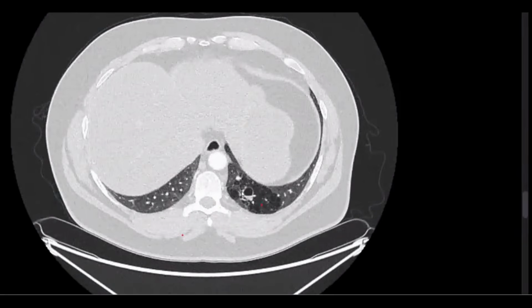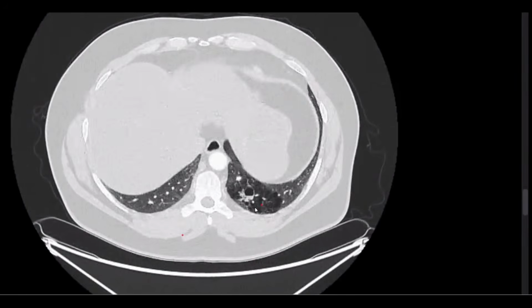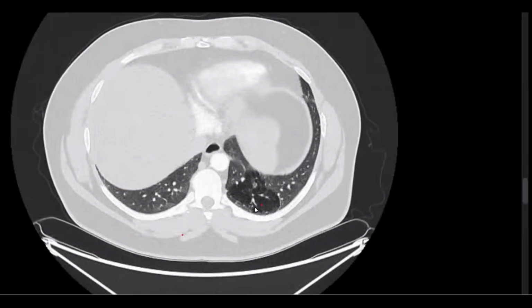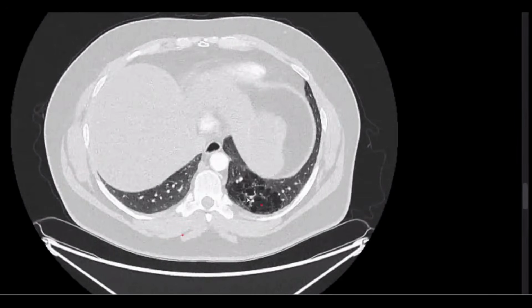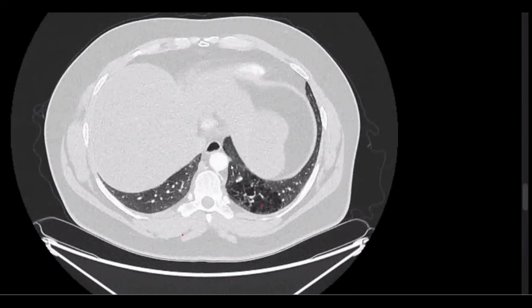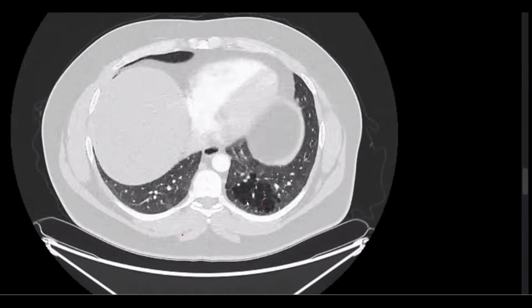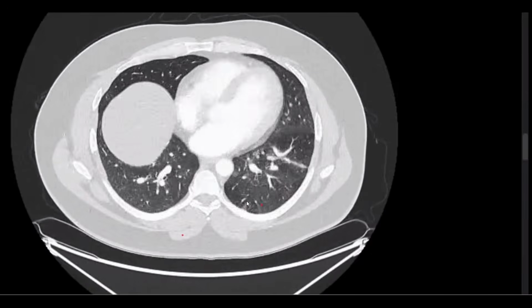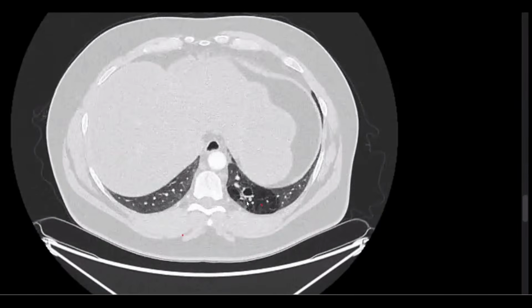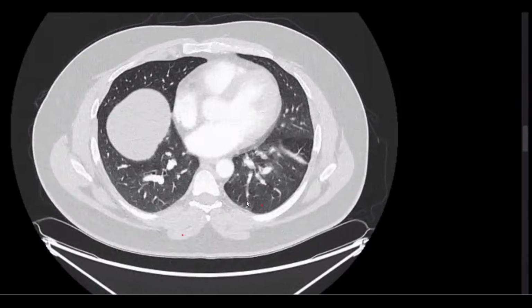Candidate number 12, can you unmute yourself again, please? Yes, sir. It's a focus of infection, recurrent infections. Yeah, it's atretic bronchial division. And a common association is secondary air trapping for this atretic bronchial division. Okay, you can sometimes find something unusual. Please search for the arterial supply and venous supply for the lesion to check the full picture of the abnormality.